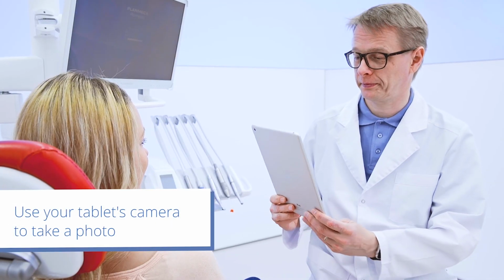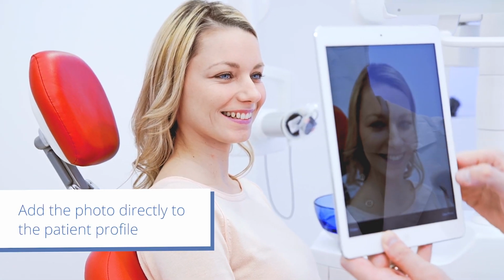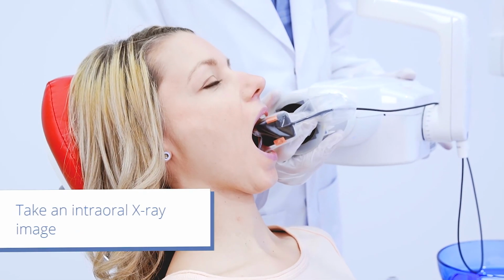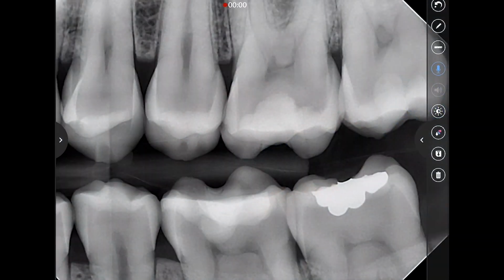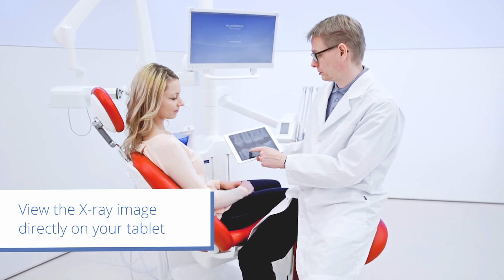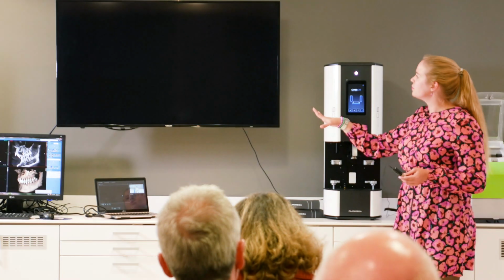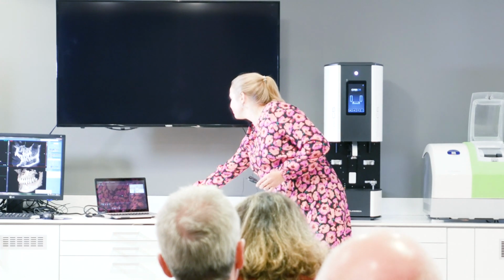We could utilize the tablet's camera for capturing patient photos that could be added to the Romexis database, as well as ID photos, or we could even use that for smile design. Then, okay, it passed quickly, but we can initiate the capturing of 2D X-ray images with the tablet interface. And then we would directly have the 2D X-ray image on the tablet, and we could immediately show that for the patient. We could even use the tablet's microphone for recording voice annotations related to the image. So we could play back those recordings later.